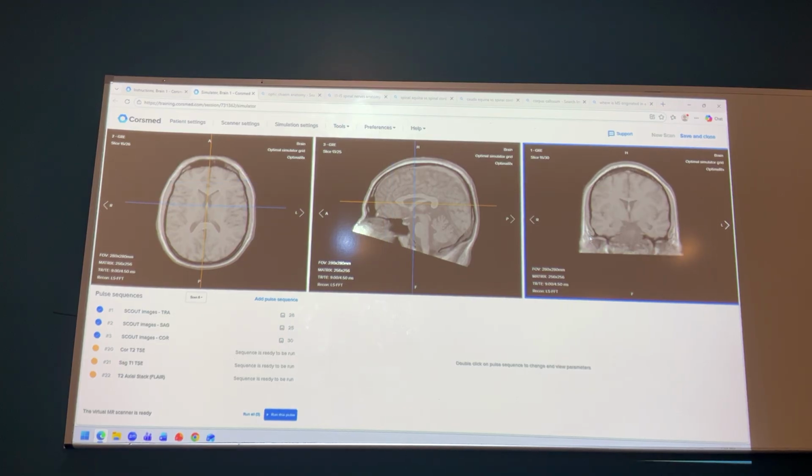And what is this plane? That is the coronal, yes, that's the coronal. And this would be your good image on the coronal. These 2 lines are your guidelines. Whenever you're scrolling through one plane, these lines are moving on the other 2, and it shows you where you are. Okay, so far it's good. Any questions?